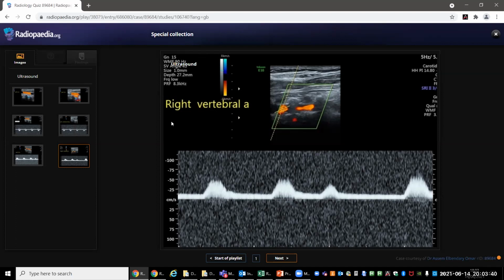Yeah, the patient presents with syncope on exertion. Okay, on exertion. So the findings shall be conveyed on an emergency basis to the referring clinician, and a CT angiogram is arranged. Okay, that's fine. So this study, do you know in what situations this study is usually done? Can you give me a few indications for this study?